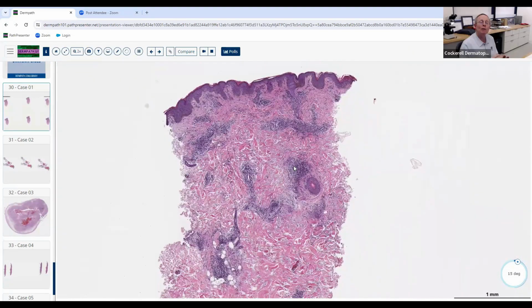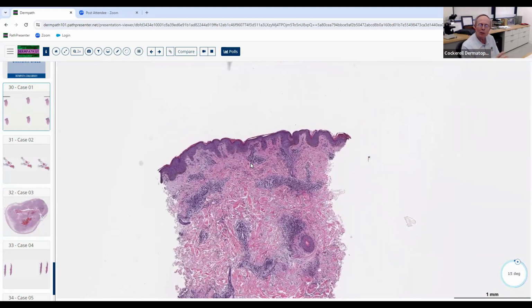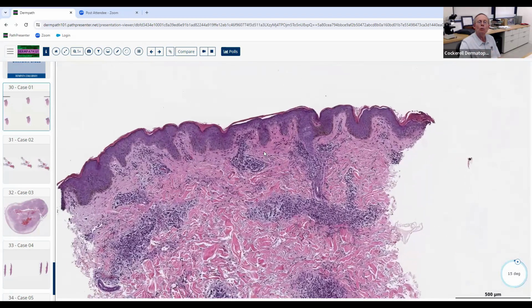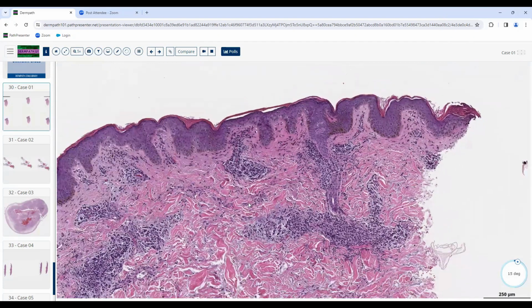Imagine what this would look like in the patient, right? It's going to look like kind of an urticarial plaque. So subacute? Well, subacute is usually going to give you more of a papulosquamous morphology or an annular morphology with some scale because there's some interface change with that. Remember, this one doesn't have much interface change here. The epidermis is spared.